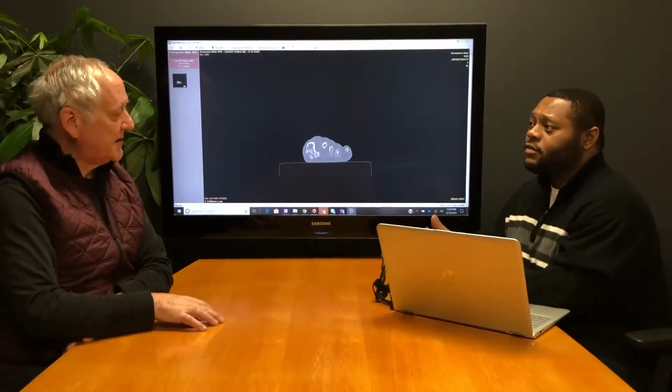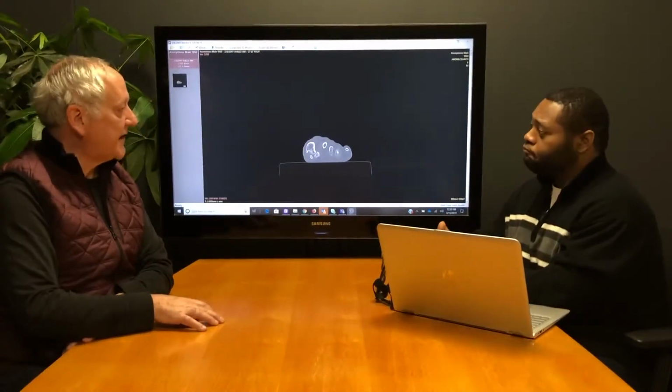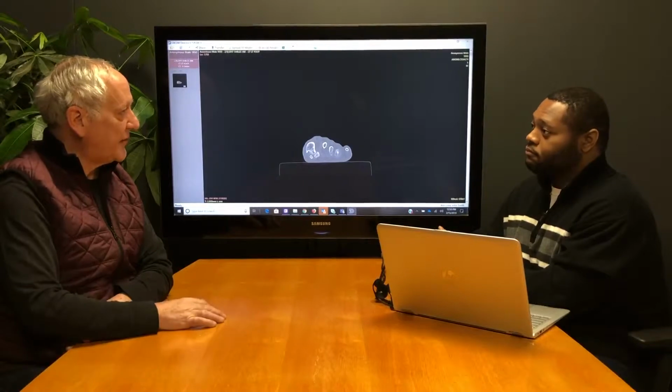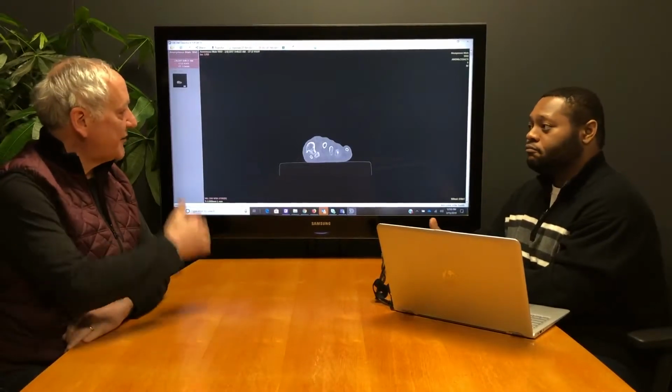Yes. And the notification will come by way of email. Okay, terrific. And once that email has come, we just go back to the PAC server and open it up and the model will be there? Yes. Go ahead and show me that. All right.